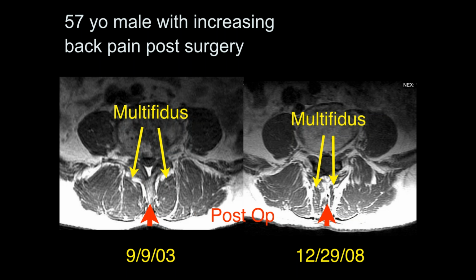And I think these muscle changes, very few radiologists really describe these. And I actually think they're important. And I think because of the lack of understanding of the possible various areas where pain can come from, a lot of people have just forgotten all the soft tissue support structures in the spine. And I guess if you're trained to look at only the neural structures, then the musculoskeletal structures may be less important to you.